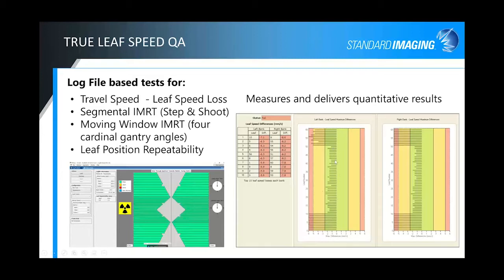But all the leaves that typically get used on a normal basis are operating within tolerances and a passing tolerance at that. What you see here are basically the 10 worst culprits, if you will, for the left bank and the right bank, and those obviously would be these leaves out on the outside here, showing you the errors there.